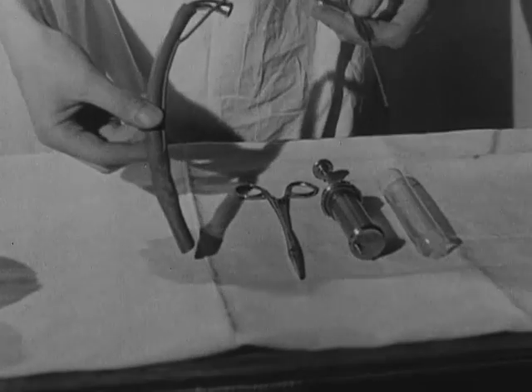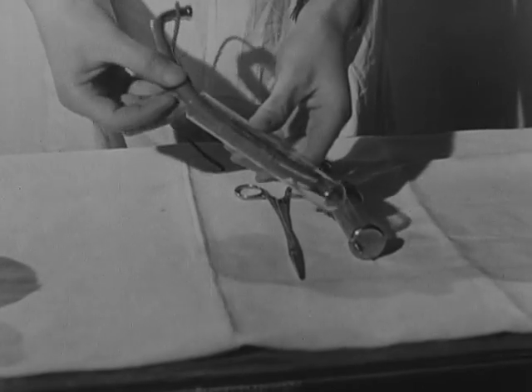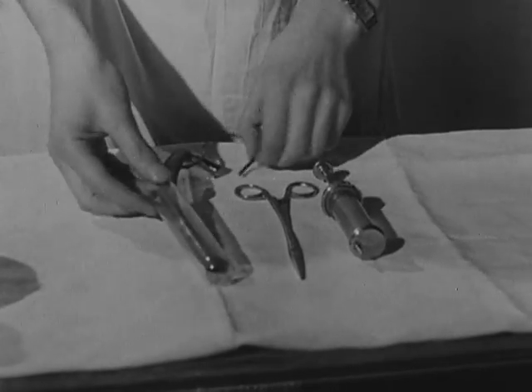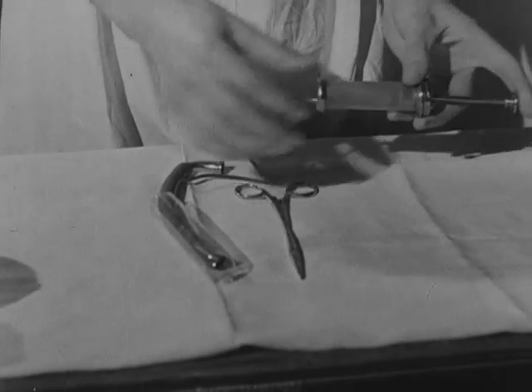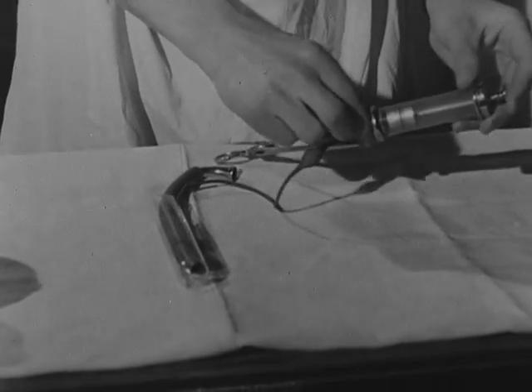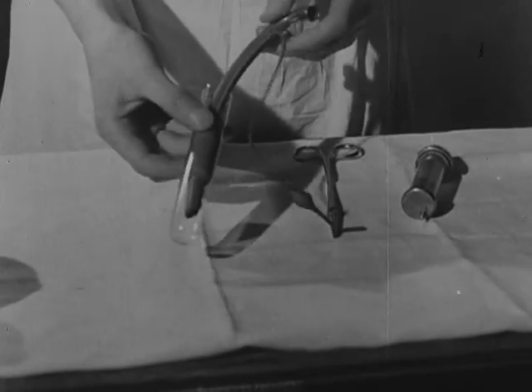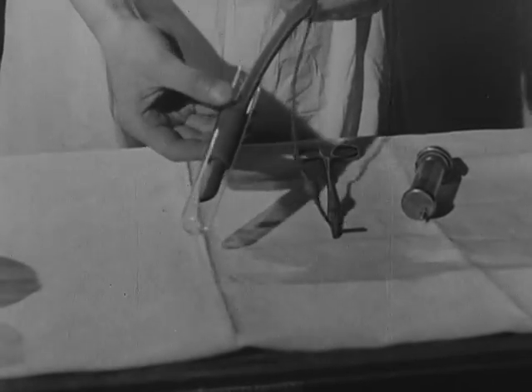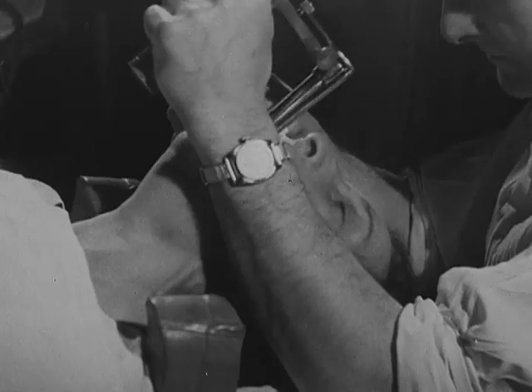An alternative to gauze packing is the Goodell Waters inflatable cuff, fitted onto the endotracheal tube itself. The tube fits quite loosely into a test tube so long as the cuff is deflated. Air is pumped into it by a syringe attached to the supply tube. This is then clamped off. As you can see, the cuff now fits firmly against the walls of the test tube and makes a watertight packing. The cuff tube is inserted into the trachea in the same way as an ordinary endotracheal tube.